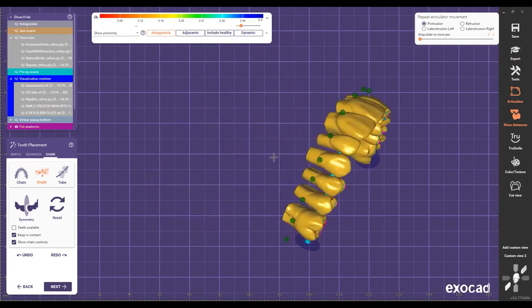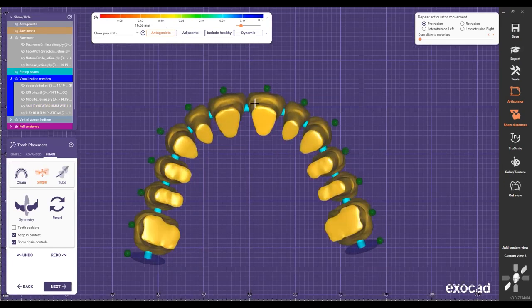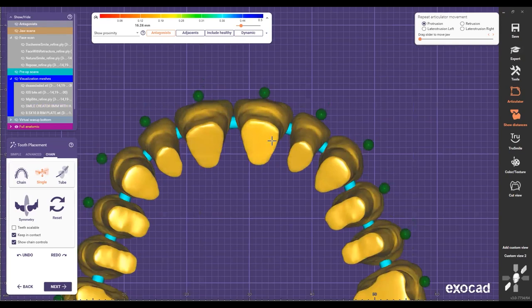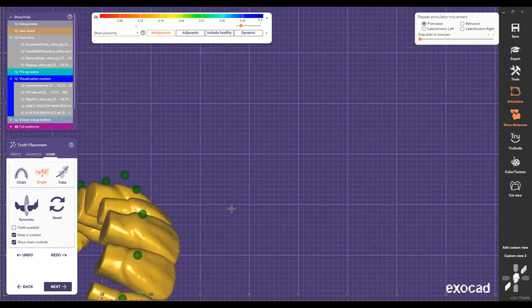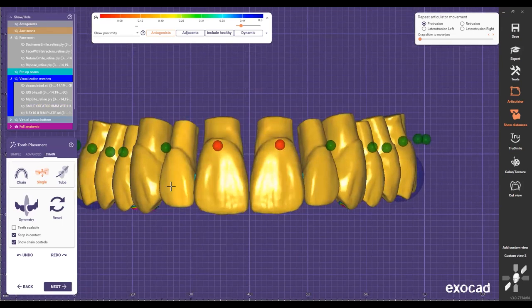And that's something that you can see, how dental technicians who are setting down denture teeth do it, right? They put their fingers on the teeth, they go side to side, and that's how you can apply those techniques here to help you. So now I can see the inclination of the teeth right there, and I just lock it. Then by default, I'm gonna keep this one to be at least 0.5 millimeters shorter than the incisor.